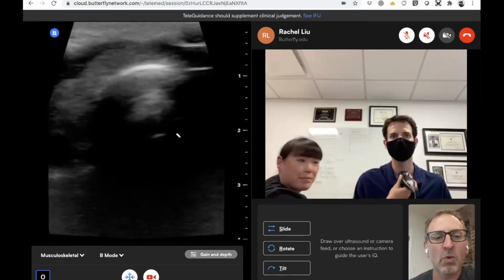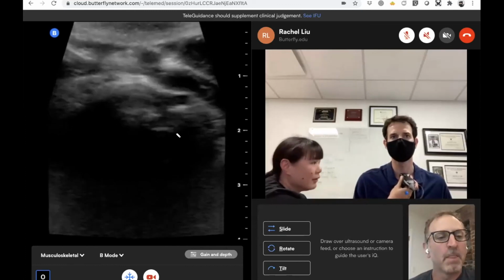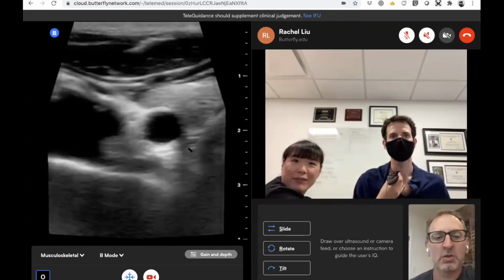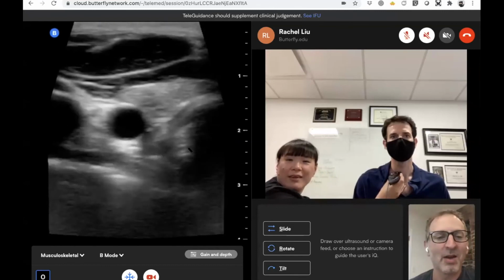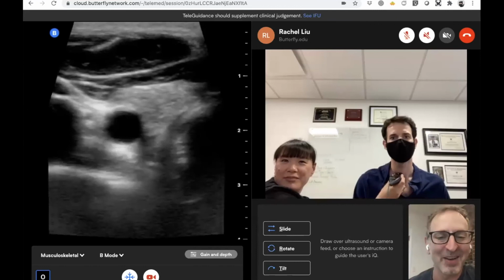Why don't we take a look at the right lobe of the thyroid? We'll come over. I'm coming over. There's a little bit of a lag. There we go. Yeah, that's okay. I think we're straining the system doing this with a simultaneous Zoom. It might just be my Wi-Fi.